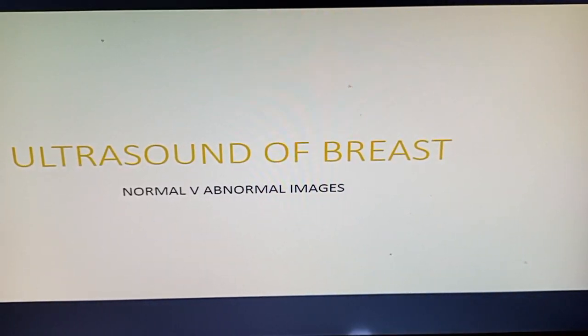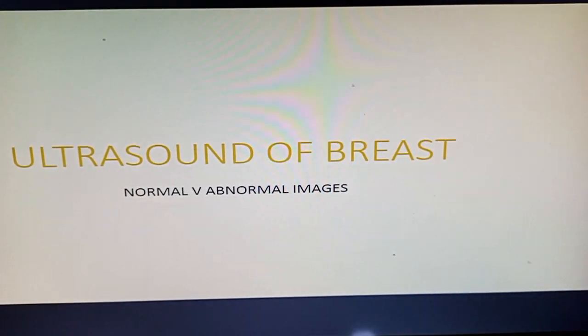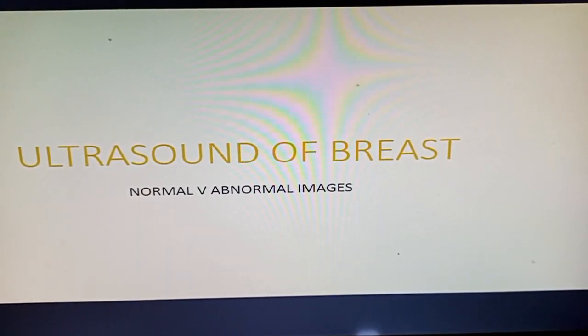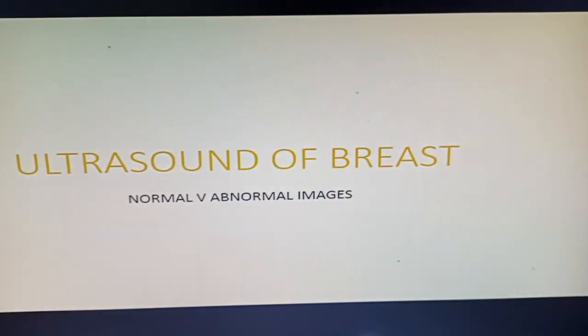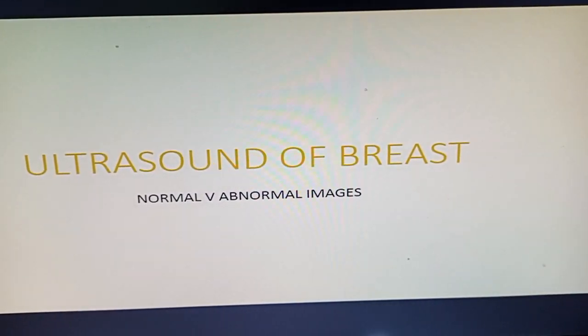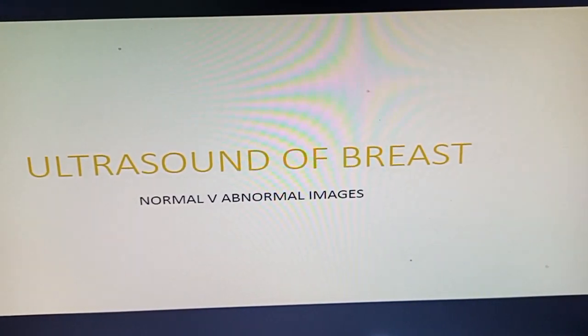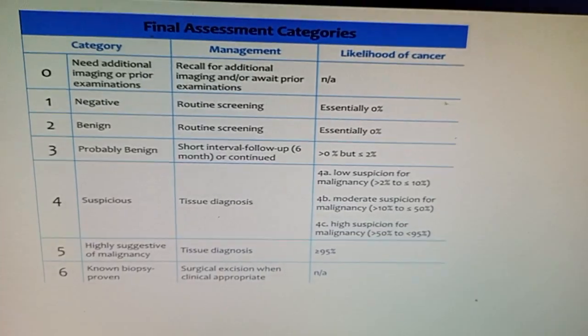Hi, my name is Dr. Muhammad Irfan. Today I would like to describe the ultrasound of the breast, normal versus abnormal image on the ultrasound. I will describe the normal ultrasound image of the breast and then I will describe the pathologies of the breast which are shown on the ultrasound.